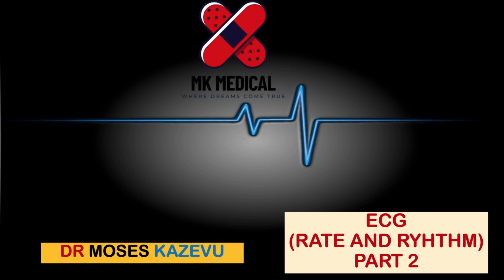Notice that I'm going to be displaying certain pathologies that I will introduce slowly, and at the end of this bootcamp we will cover a certain number of conditions that are important in terms of important ECGs that you need to know, different abnormal rhythms, such that you'll be able to pick up these patterns when you report them on the ECG.